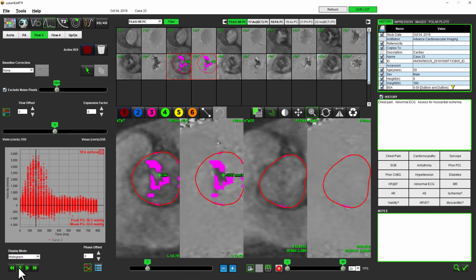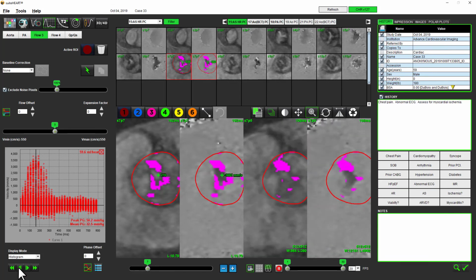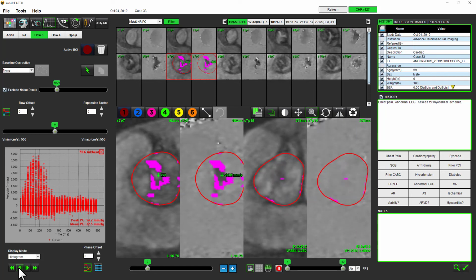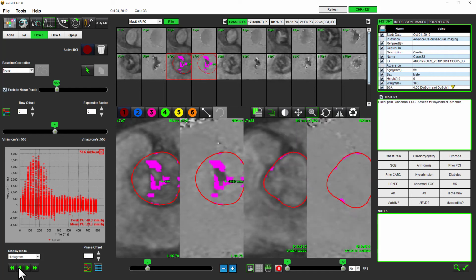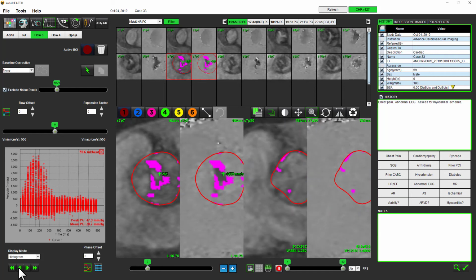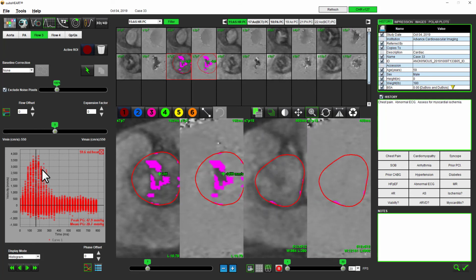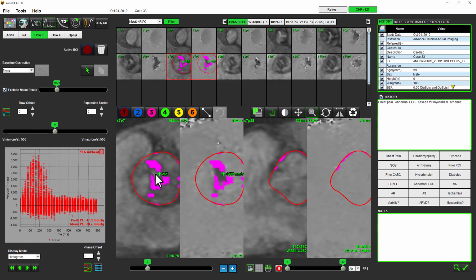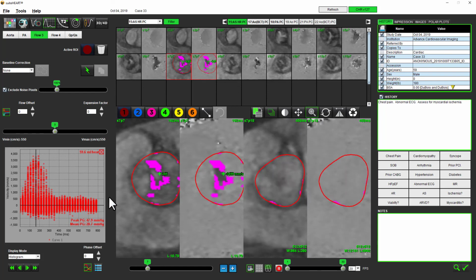Now, if I want to march down to see what the second highest velocity pixel is, I can click on this value here, and it will take me to another pixel. The next highest velocity is 3.6 meters per second. The next one is there, and the next one is there, and so forth and so on. So you can interrogate these pixels and make sure you're choosing a pixel that has good signal in it, and so therefore is giving you a reliable value.